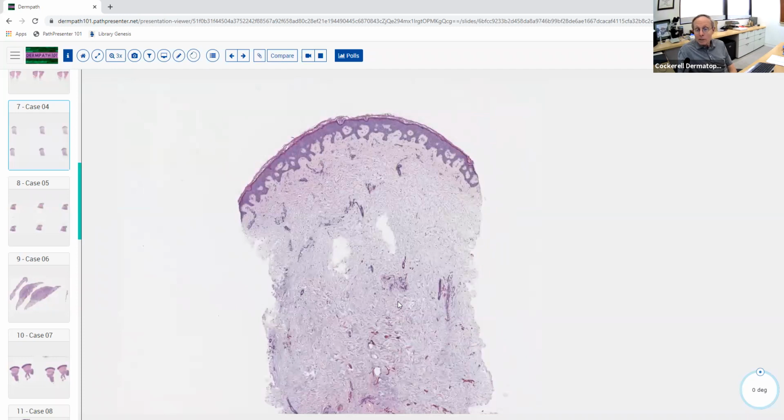And if you're dealing with a soft tissue tumor like DFSP, it's almost like Google Maps. It can look like one thing in one area and a totally different thing in another area. If you biopsy Main Street, it's going to look totally different than if you biopsy Broadway. So you have to realize that in these large tumors, they get multiphasic morphology, talk about biphasic, triphasic. So taking a punch, you can miss it. Just remember that as more of a teaching point. But that's a good example of mucin.